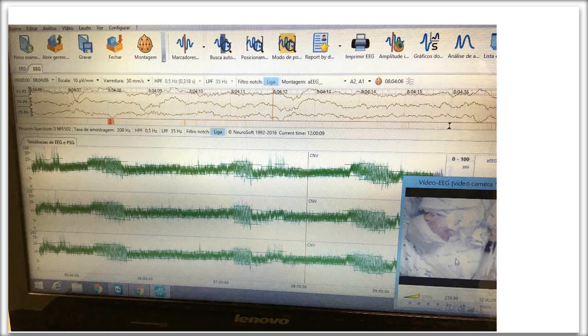So I think you can definitely see it maybe in the second channel of the aEEG. It's a little bit lower and you can see the widening out a fair bit more because it's dropping so much more below the 10, and you can see it widen. When his sleep cycles stay closer to 10 or 12, I think we're not seeing that nice thickness that we're used to because the margins are so high.